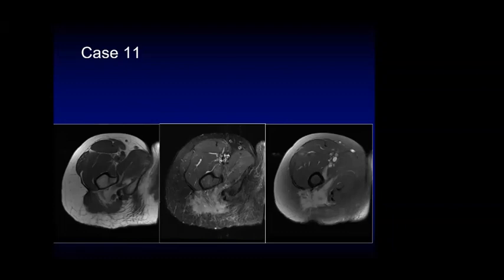Differential signal in T1, well, T1 is not really high signal. Maybe we could call it sarcoma. Well, this one is difficult, a little difficult.